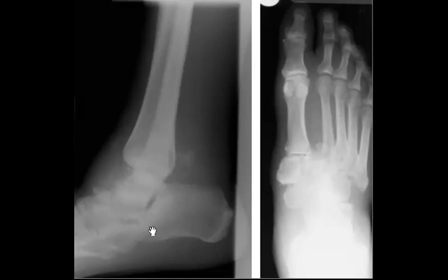If you find the Charcot joint, go search for Lisfranc. And if you find Lisfranc, go and ask first for trauma. If there is no trauma, then suspect that it is a neuropathic joint, then go and see the ankle. Okay.